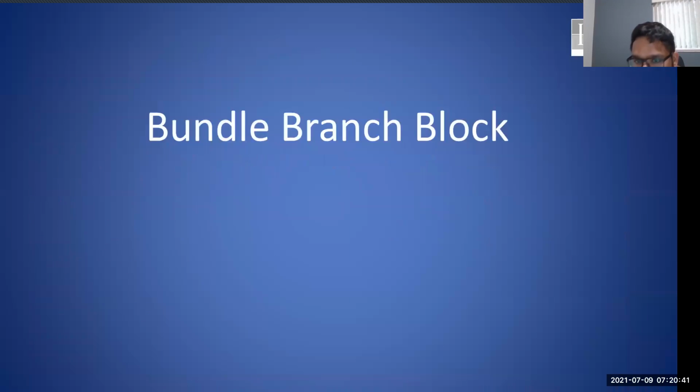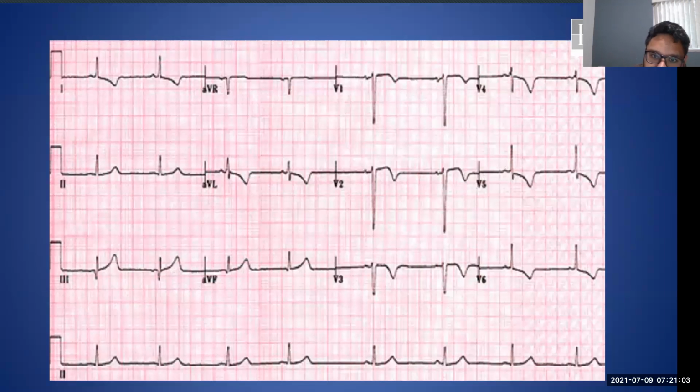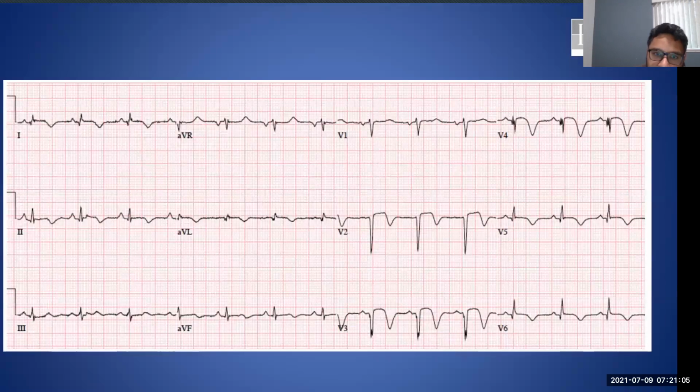Charlie, quick question. Are there certain leads where you're always going to find the T wave is inverted? With V1 to V3, what I'm seeing is that normally the T wave is going to be inverted in those leads. Is that what's normal for that?